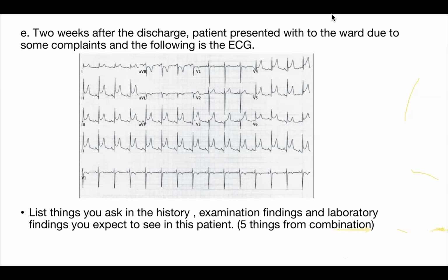And what would be the presenting complaint in this patient? The chest pain relieving when bending forward. Yeah, so it is a pericarditis chest pain, right? And just know what we can do for this, right? Usually we can give high dose of NSAIDs and colchicine, right?